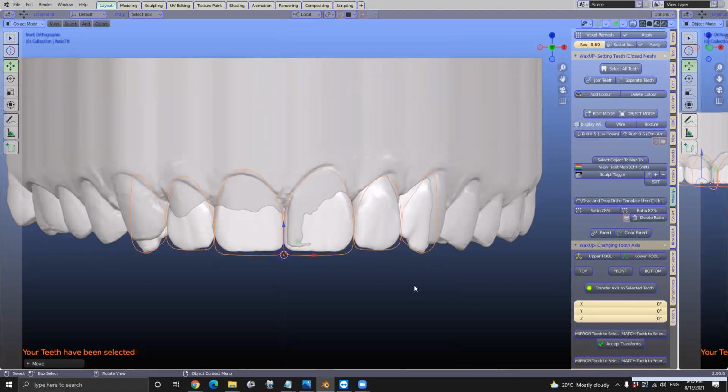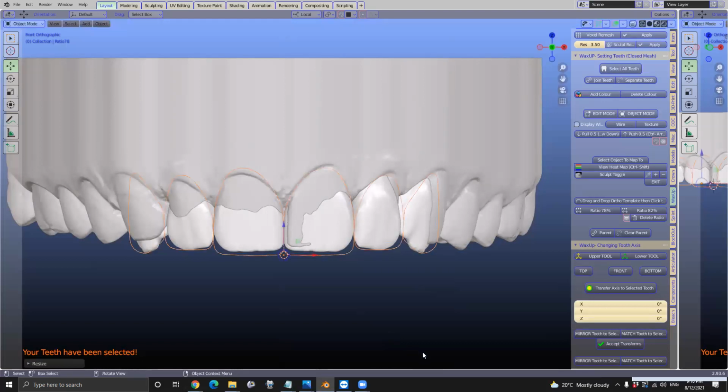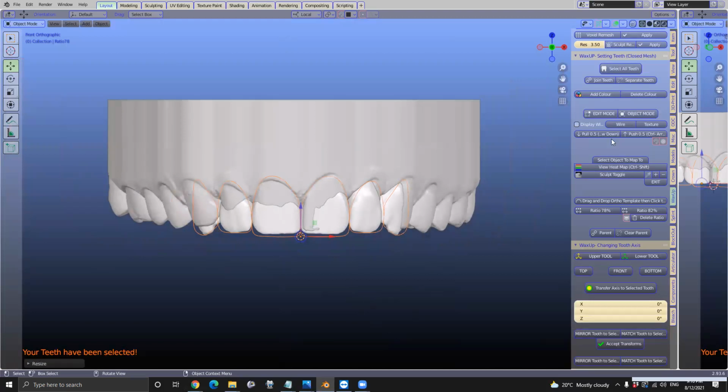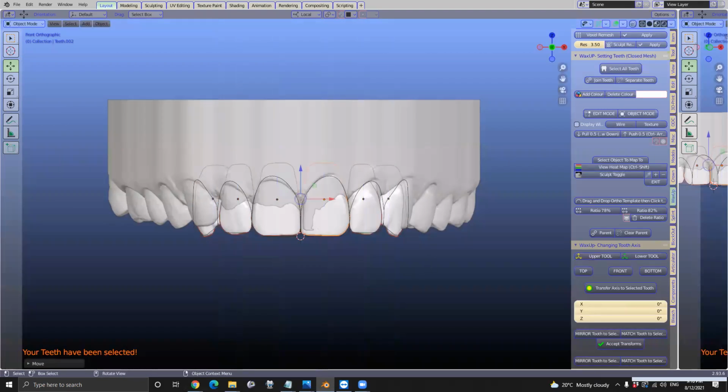Now, if you scale this, we've still got the 78%. So it doesn't matter how big or small you make it, the front incisors are always 78%. So let us head down to something maybe like that. Okay. And then we're going to select the teeth, and then we're going to move these teeth to that line. And of course, we can scale these teeth as well if we want to. So S to scale. Okay.